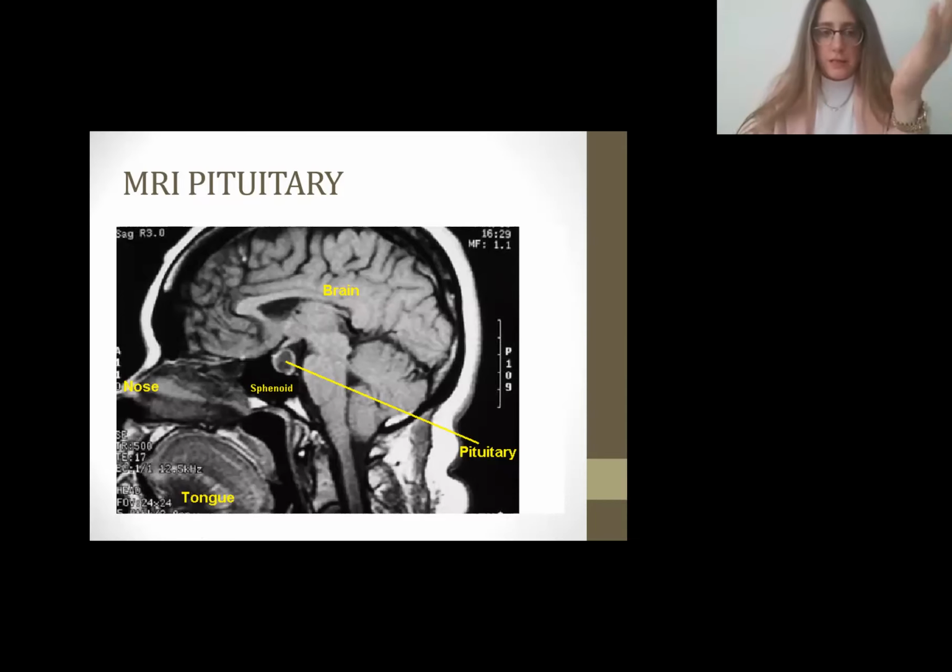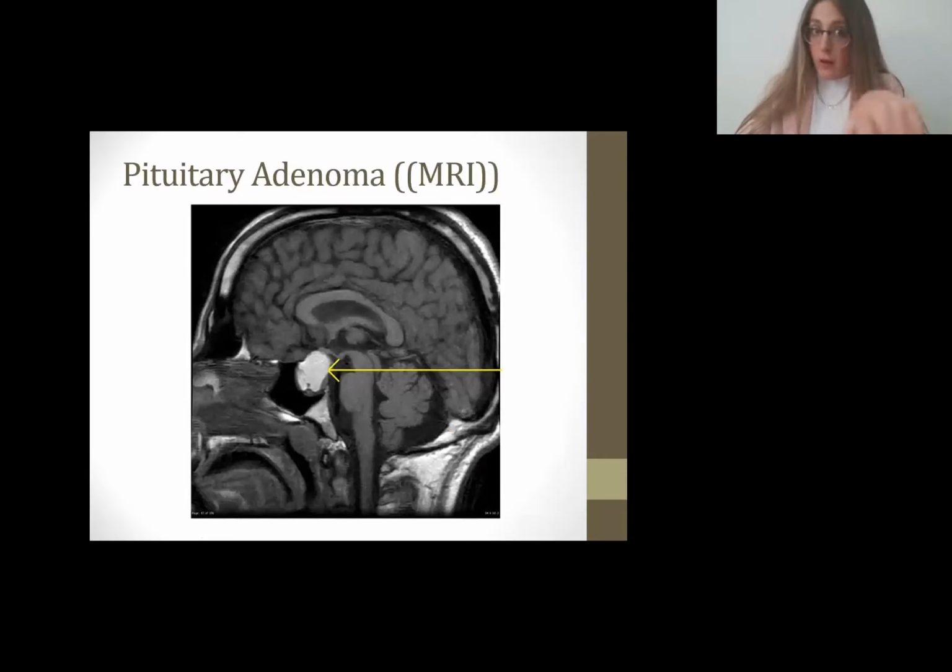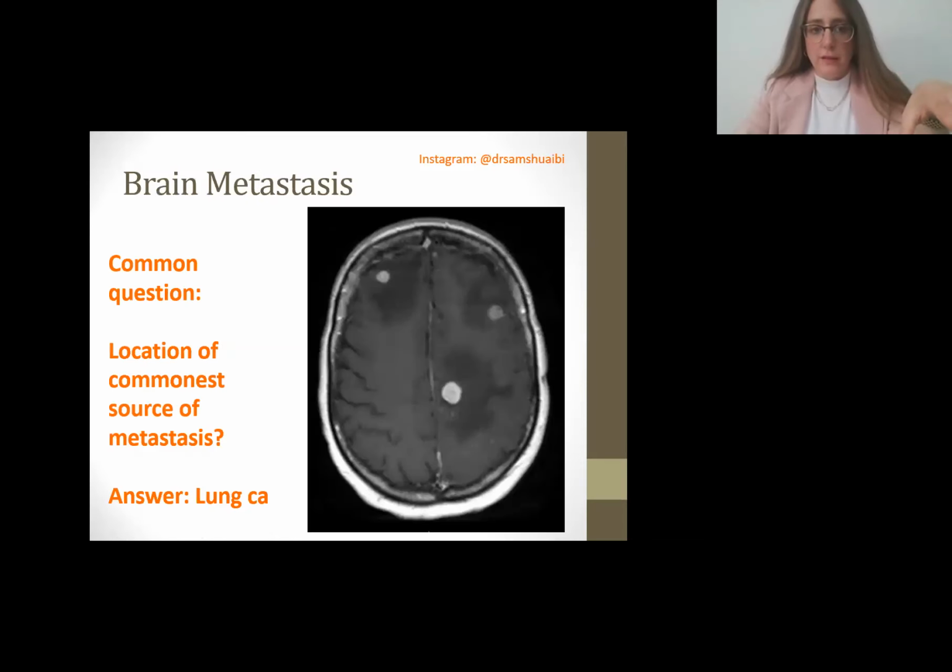For that reason, I encourage you after this to be familiar with where the pituitary is located. This is a pituitary adenoma. There you go. Okay, so please just familiarize your eyesight with how it looks. Very, very important to know. Okay, all right, so I'm going to move on after that. I think we'll just have a few slides left.